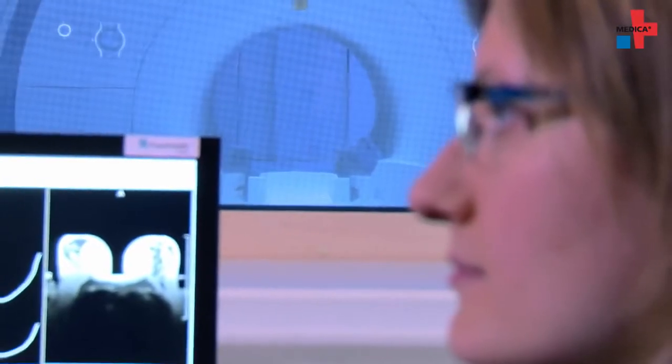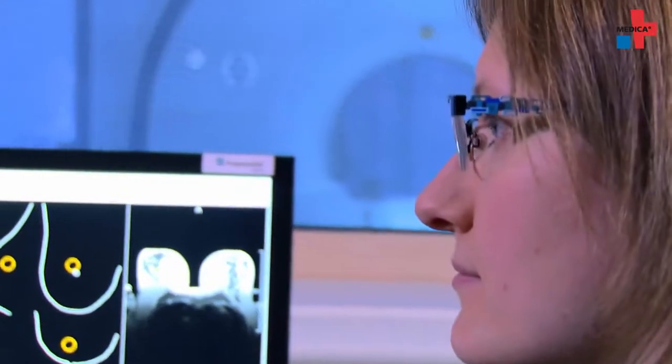During magnetic resonance imaging, she lies on her stomach, during an ultrasound, she lies on her back, and during mammography, she's standing up and the breast is clamped between two plates. The different positioning also causes the breast tissue to be pictured differently in the images. The radiologist needs to consider this if he wants to compare different images and determine the position of a tumor on another image, for instance.